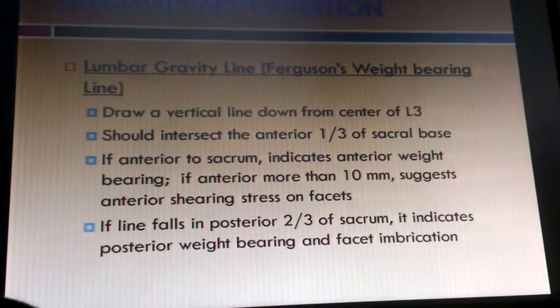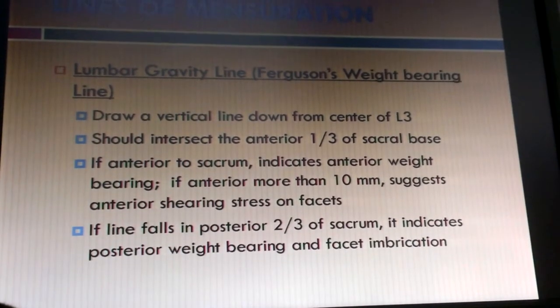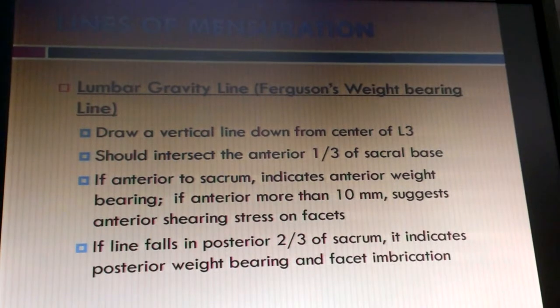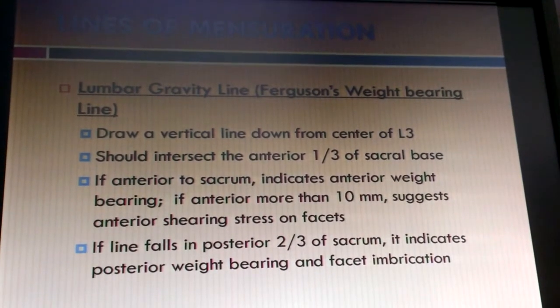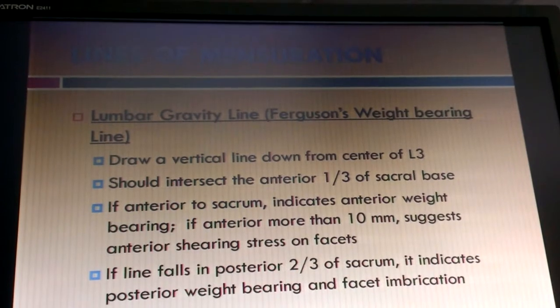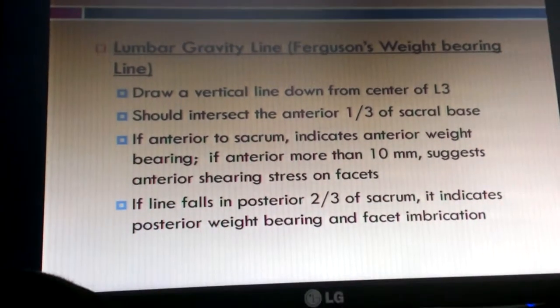In the cervical spine, we didn't seem to care where that line was in the thoracic spine. It's somewhere out in limbo there in front of the spine because of the kyphosis. But we do know that that same line that we drew from the tip of the dens that went through the anterior 1/3 or 1/4 of C7, and now it's traversed the thoracic spine, is going through the middle of L3, and then it's going to go through the anterior sacral promontory.